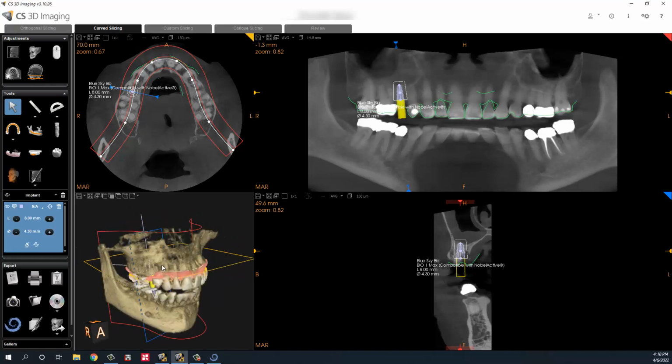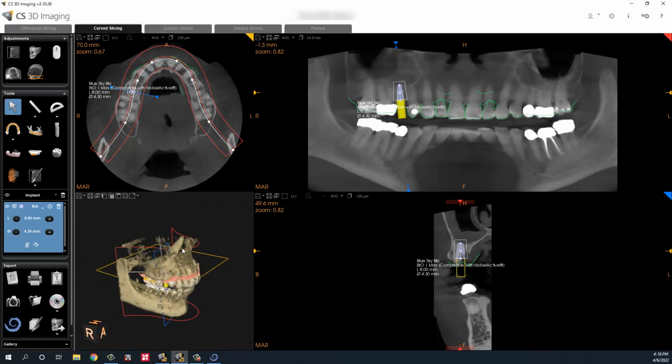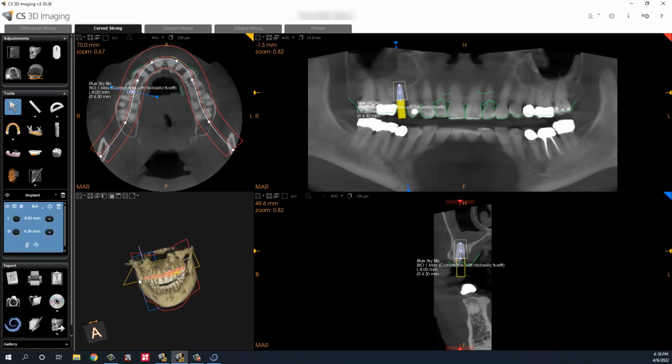I'm a big fan of this unit. This is the 9600. This is just a 10 by 10 scan, but it can take a much larger scan if needed. And I can get the whole head for ortho and stuff. It's massive. The CS8300 takes a scan about this size, and so if this is all you need, then the 8300 would be great. It's the same kind of quality scanner, pretty much. They're awesome scanners. So, just an opinion, but I think it's a fairly well experienced opinion.